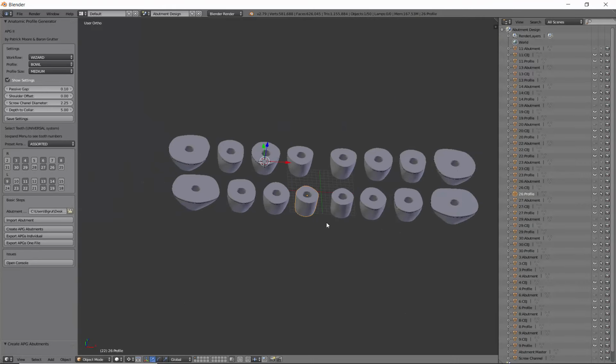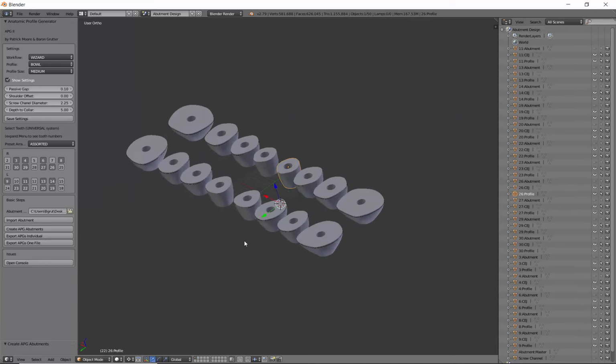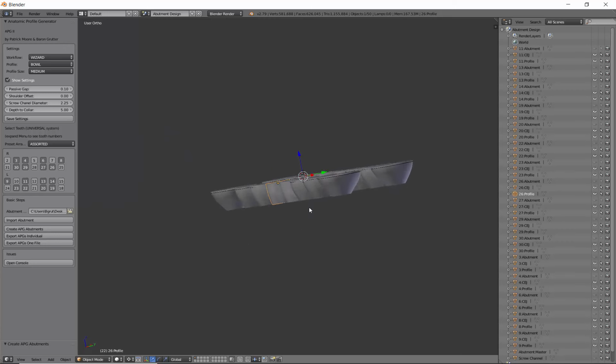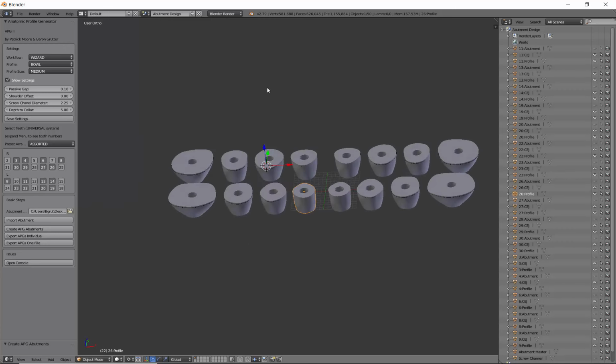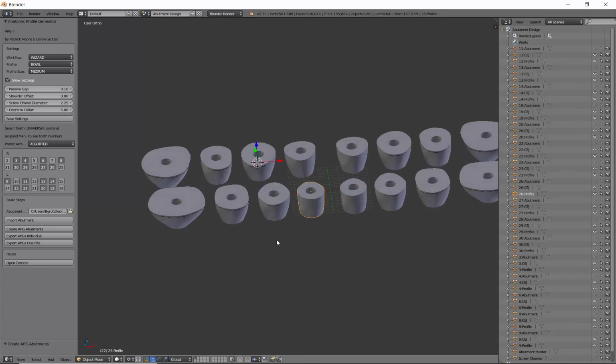You don't need to know this. You don't need to click on any of that. That's just if you want to look around at everything and you're trying to figure out how to navigate. Now you know. It is not imperative for this workflow to click anywhere in this 3D environment, but again, now you know how to get around if you want to.